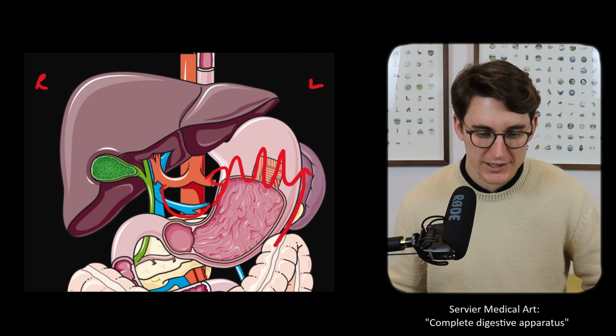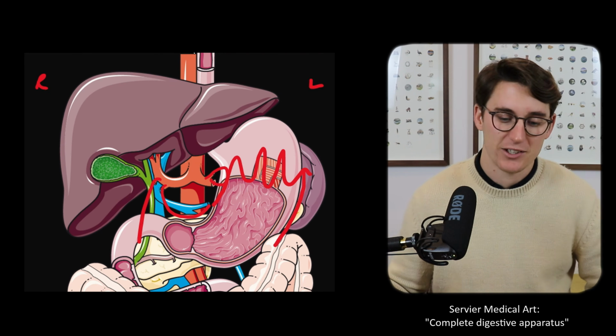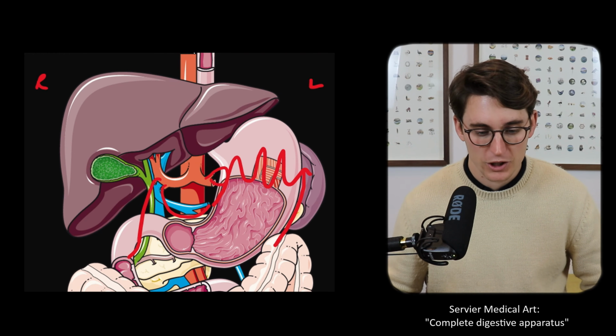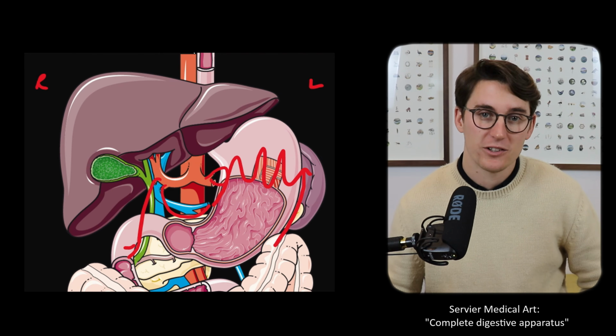It's still common hepatic artery, and it gives off a gastroduodenal branch that dives down into the abdomen. We'll see that nicely on our CT scan. That gastroduodenal branch gives off a small branch here, or a couple branches, to the superior pancreatoduodenal artery.